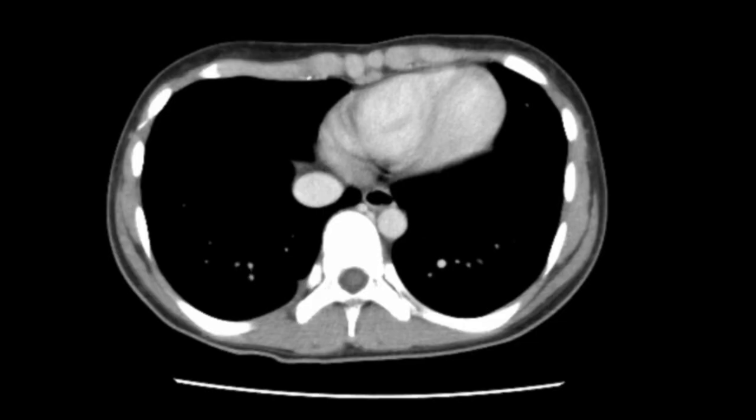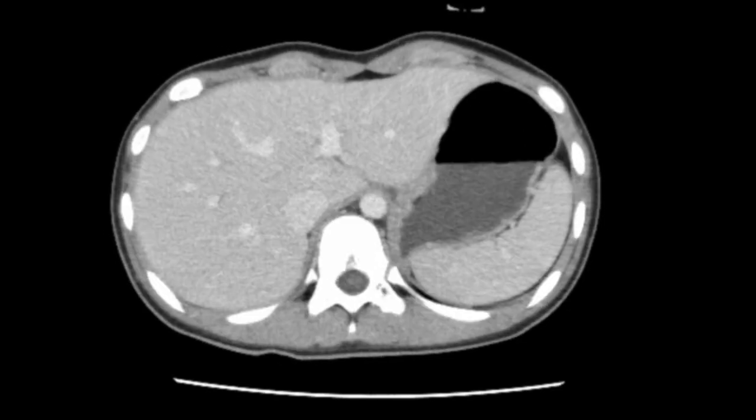Let's take a look at today's case. I'll start by scrolling through the images quickly.